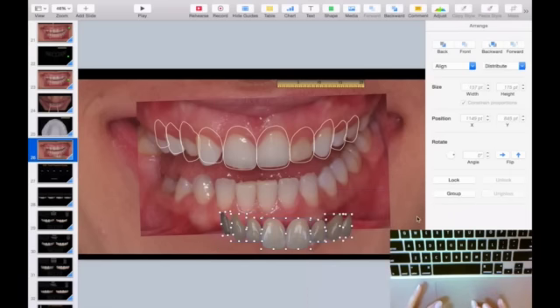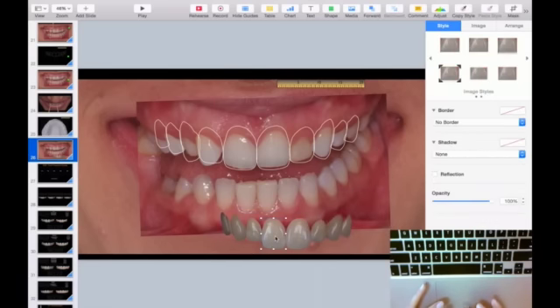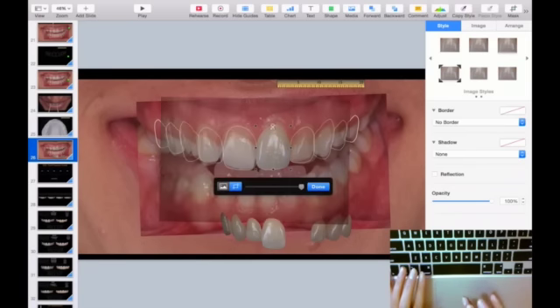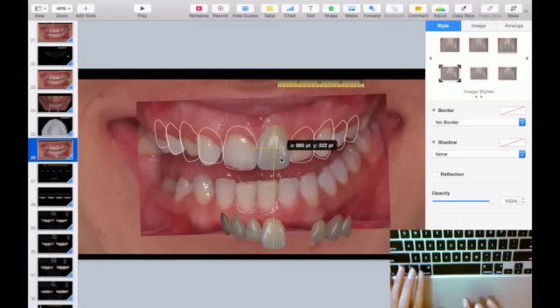I ungroup it. And I'm gonna do one side, adjust coloring, and then I'll do the other side. So I'll take this, I'll place it here, make sure I get to the full size. I'll take the lateral and do the same thing.